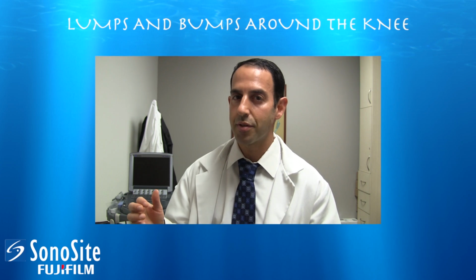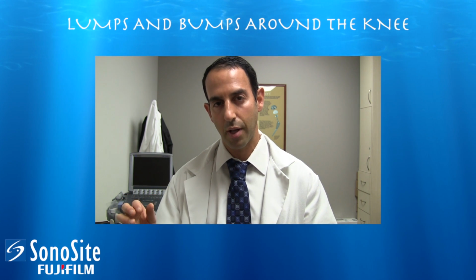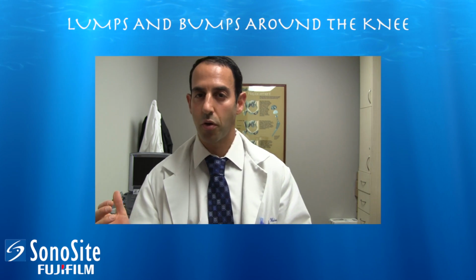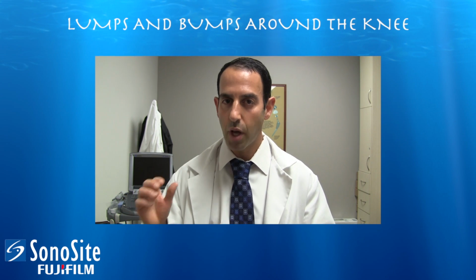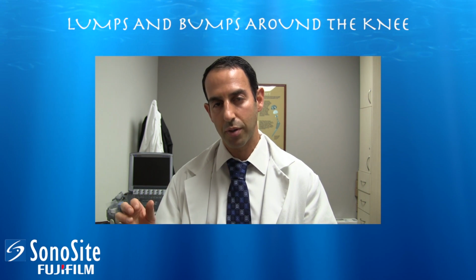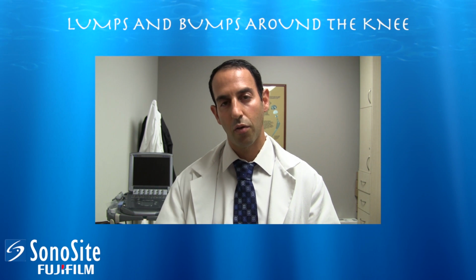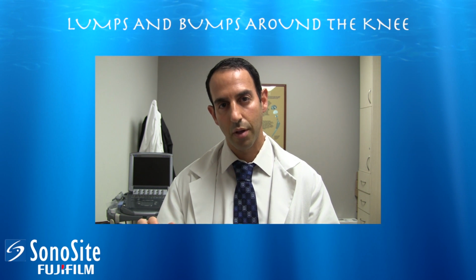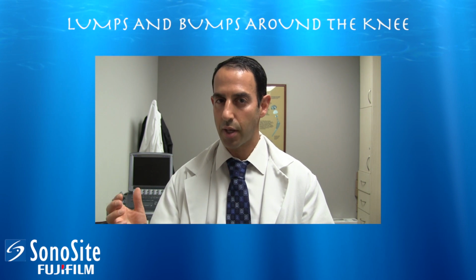Baker's cysts have been described as distension of the bursa, basically between the medial gastrocnemius tendon and the semimembranosus tendon. In patients over 50 years old, 50% have communication with the knee joint. When you diagnose a Baker's cyst, you want to be able to see a stalk between the medial gastrocnemius tendon and the semimembranosus tendon. Baker's cysts usually are located distal to the joint, right over the medial gastrocnemius muscle. If you start noticing a cyst more proximally, then you start thinking more of a ganglion type of cyst.